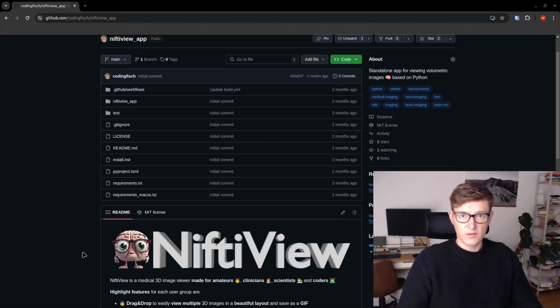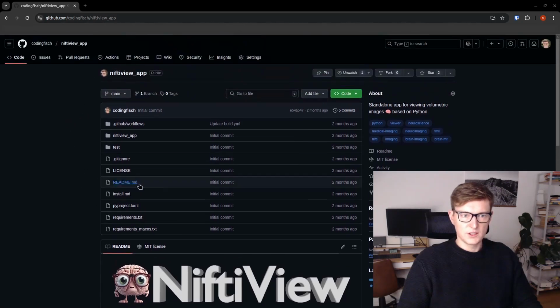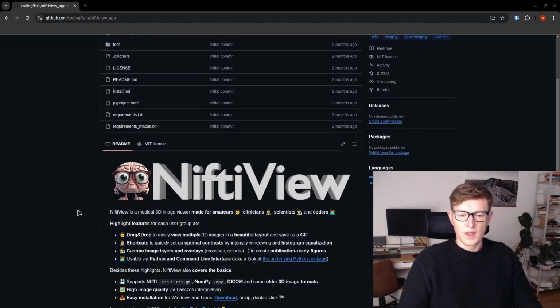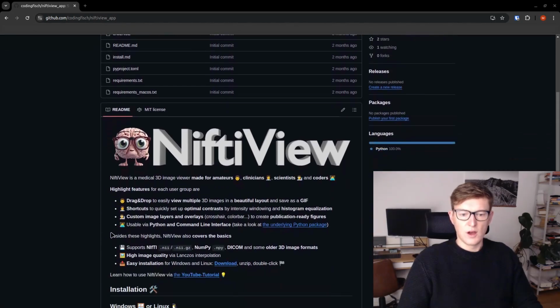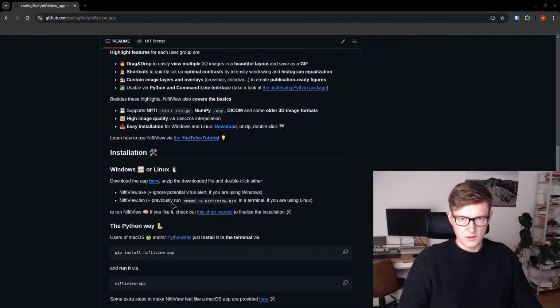But first off, if you haven't already, go on the NiftiView homepage as shown here. Hopefully there's a link in the YouTube video. And then you have to download NiftiView via this link. It's just a simple file. Then unzip it and then double click on it and do a bit of extra stuff which is written down here. And then you can start and go along with the tutorial.